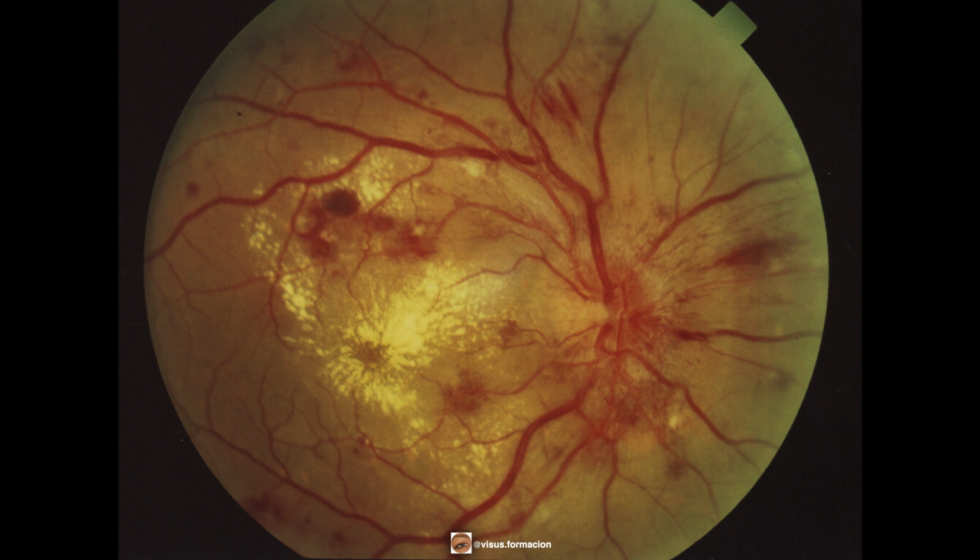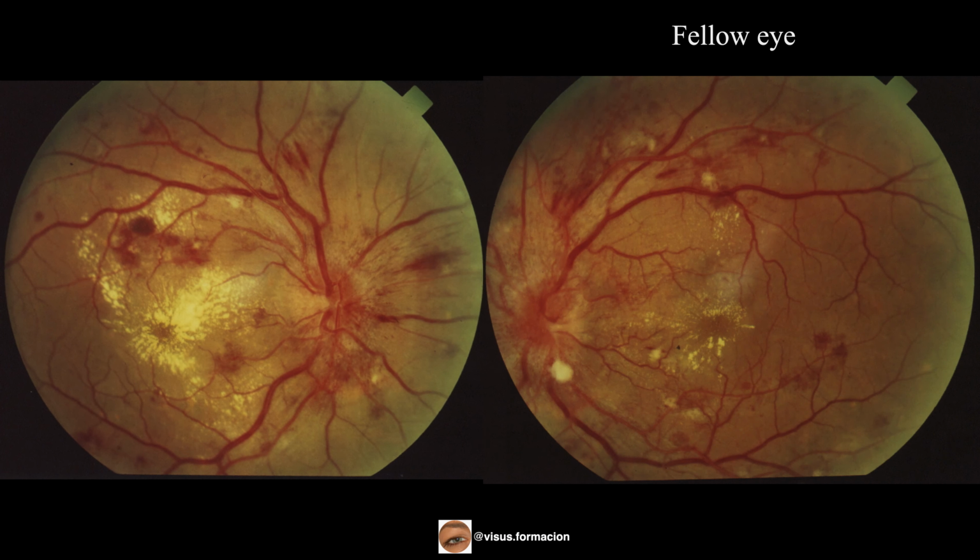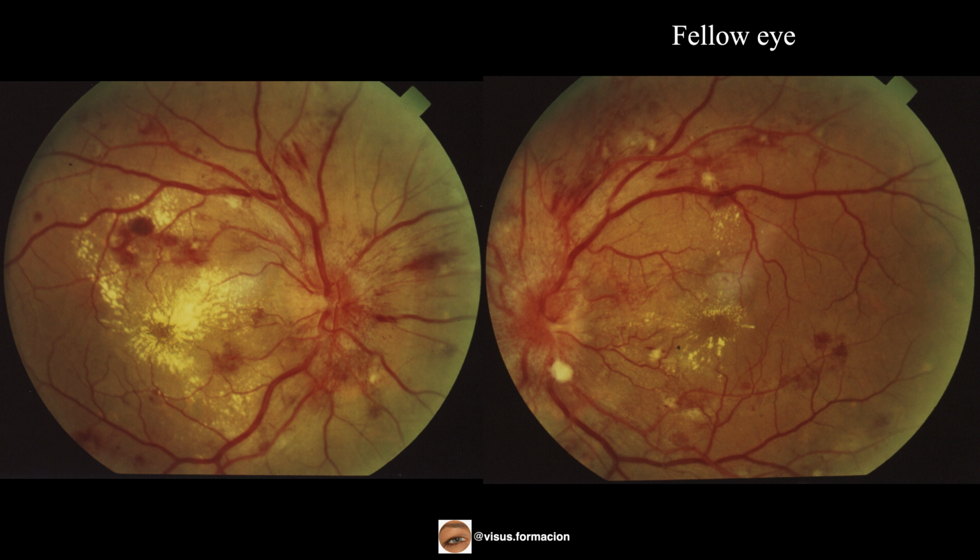Here we can see the retinography of the right eye of the clinical case. And here you can also see his left eye.